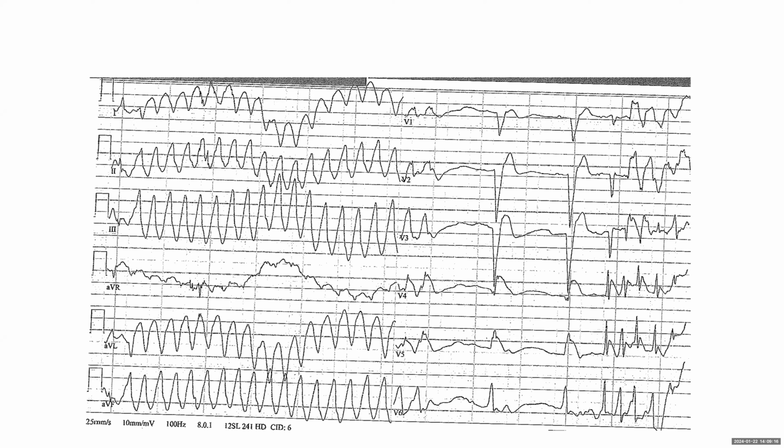And there are other things you could add. So you could add sinus rhythm. We have 2 beats of sinus rhythm. I think it's okay to say left bundle branch block, although probably in real life it's not left bundle. But I think it's fair because it's wide. It's okay to say conduction delay, ventricular conduction delay. Wandering baseline is also, I think, a fair one. So many codes for this one.